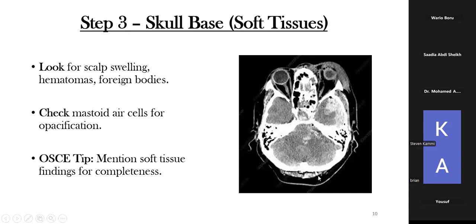And then here, there's also some bit of soft tissue swelling. Reason being, if you look at coup contre-coup injuries, most likely this patient hit their head first. Then when they hit their head, they bumped back into something and hit something back here. So you can see there's also some soft tissue swelling. So I hope I've answered that question with regards to pointing to the soft tissue swelling.